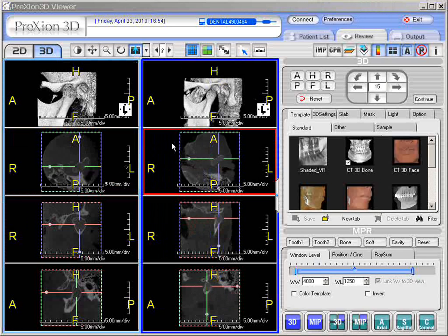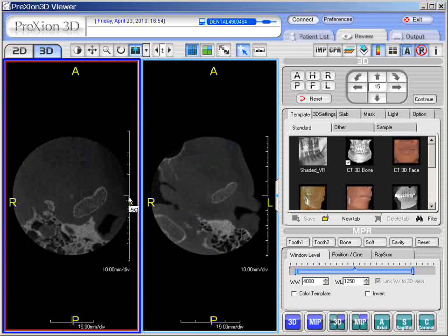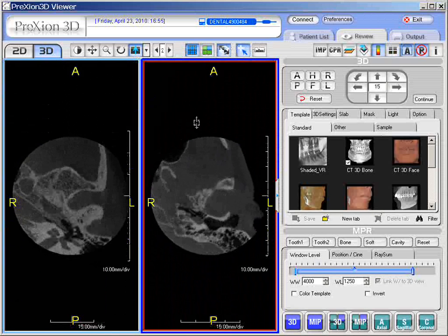Now, once we've got the left click position for the axial, we go back to the synchronization button, click it, and double click it, and now we've got the slice projection for the left and the right. Actually, sorry, we have to synchronize them both. Yes, now we can synchronize and move them in tandem.